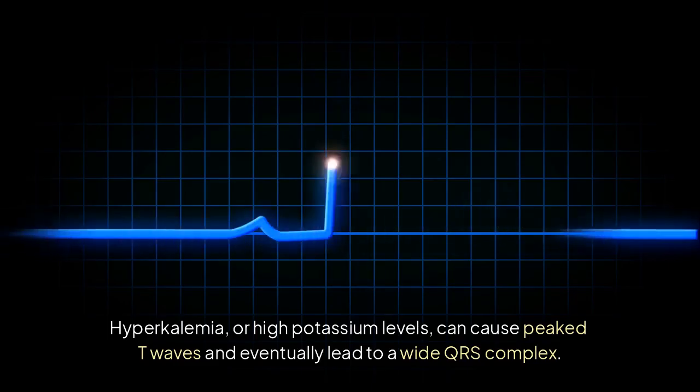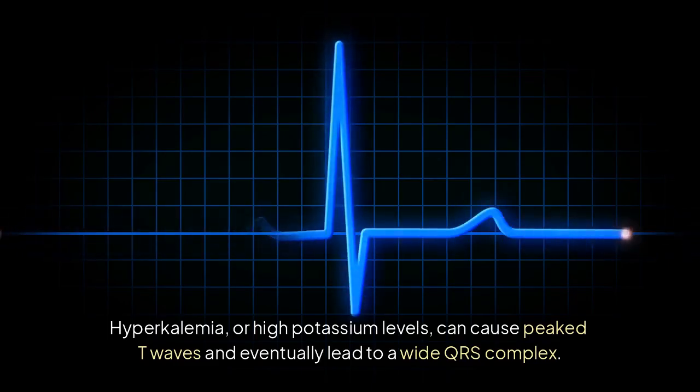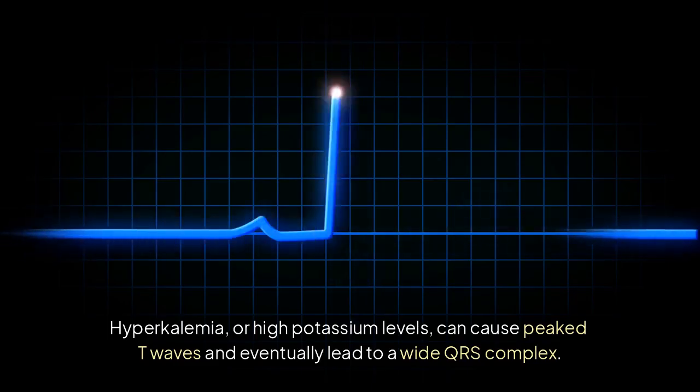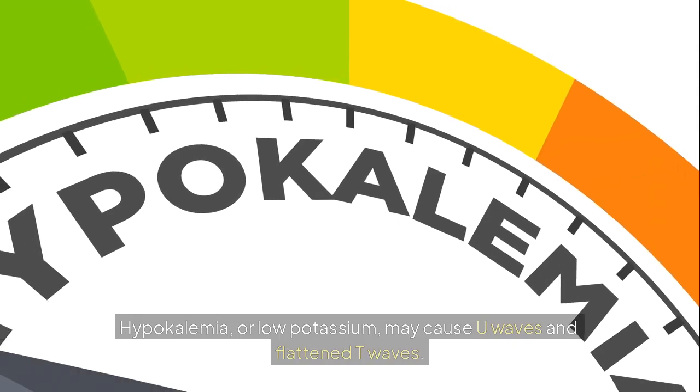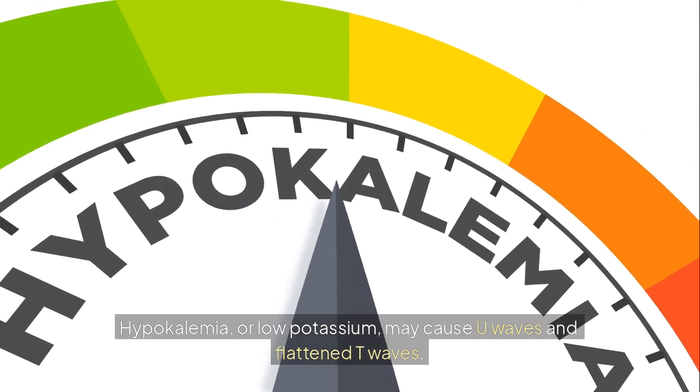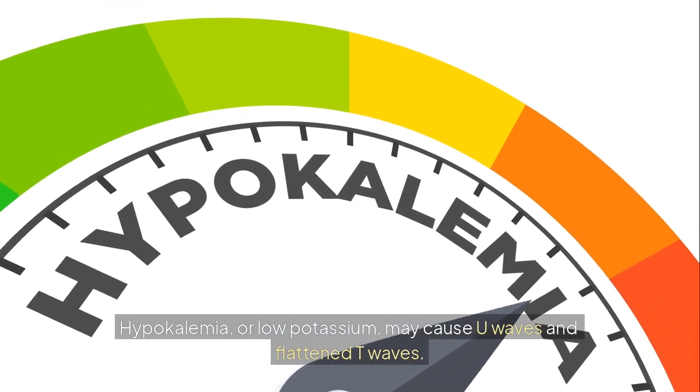Hyperkalemia, or high potassium levels, can cause peaked T waves and eventually lead to a wide QRS complex. Hypokalemia, or low potassium, may cause U waves and flattened T waves.